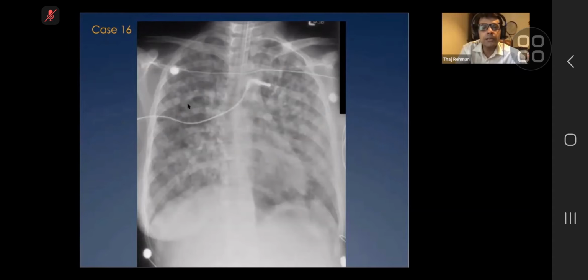So the learning points are how to identify acinar opacities, how to distinguish the distinct nodules of miliary TB and the slightly larger but still distinct nodules of subacute hypersensitivity pneumonitis, and how to differentiate the appearance of sarcoidosis, etc., from a case like this, where it is a widespread acinar opacity, acinar nodules coalescing into opacities in acute varicella pneumonia. Okay?